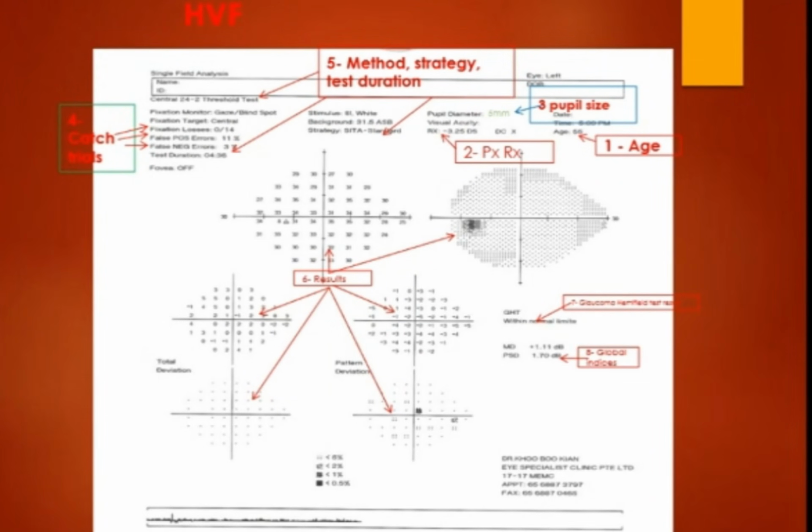We also have the global indices, comprised of the mean deviation and the pattern standard deviation.